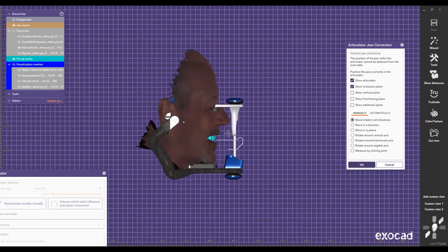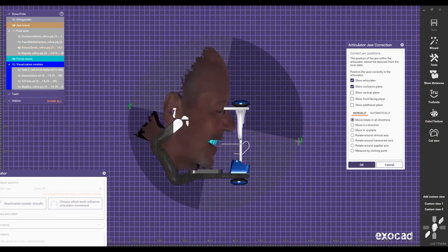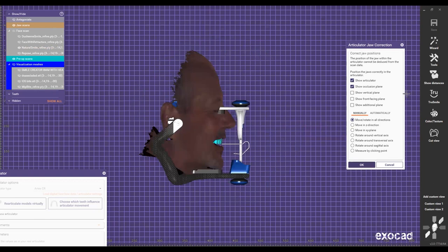And how do we find the natural head position of these patients? We don't have anything level to the floor, so we're able to find this position in Exocad with the face. Here I'm trying to make sure that the patient's head is not facing down or facing up. I'm looking for a nice profile view. I always tell my students and attendees: on the right side of your screen, there's a big mirror, and the patient is looking at that mirror, so they put their head straight to it. It's like when we go to the restroom and see our faces in the mirror, we always put our face straight. That's basically the position we're looking for here. I can see a nice imaginary angle from the chin to the nose and the nose to the forehead, and that's what I'm looking for.